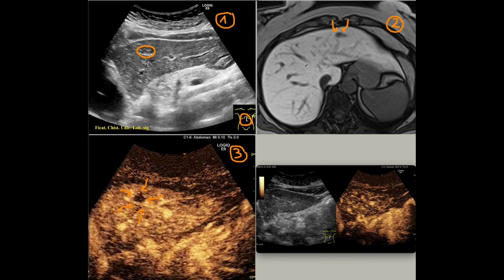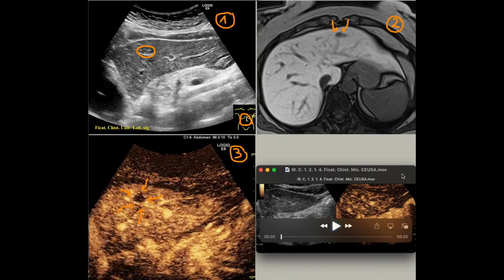an encapsulated oval lesion with an intermediate type structure, with an MRI appearance probably liquid, with an avascular contrast appearance, points towards a benign formation, probably a simple cyst.